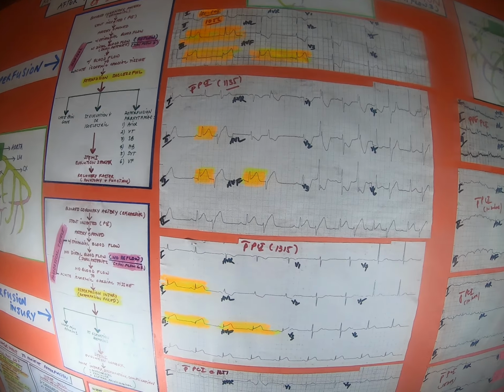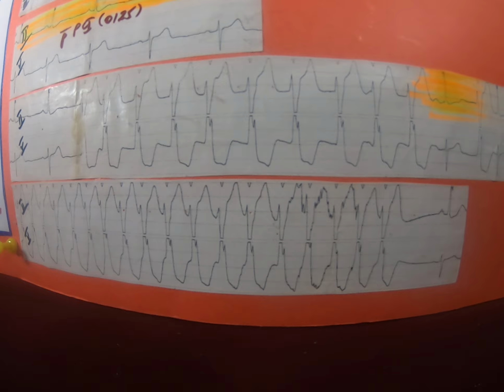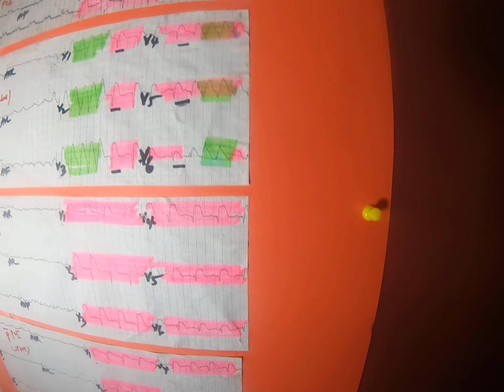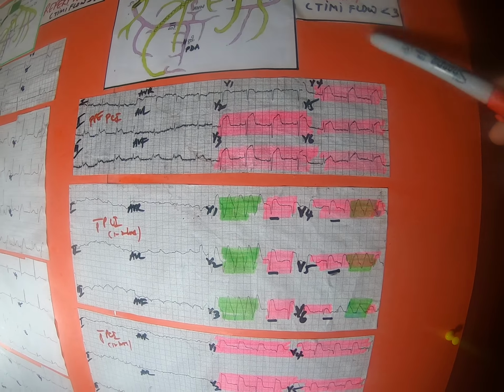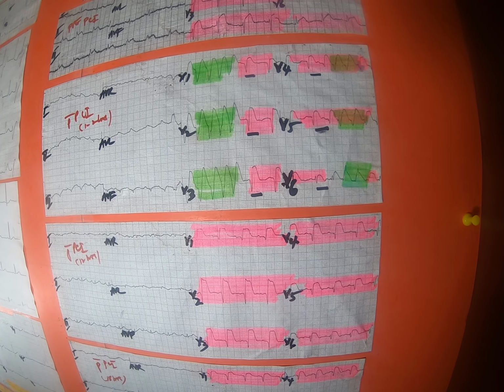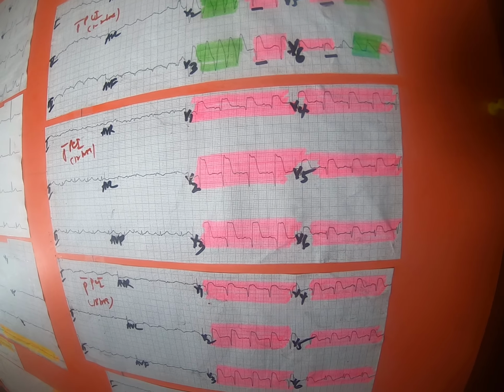You see here again, the reperfusion arrhythmias are caused by automaticity, not re-entry. And here we also got slow VTAC, but again we don't have a reperfusion here. So keep an eye again, lytes and everything have to be checked, as I said. Full assessment, avoid failure, avoid restenosis, and keep an eye on those arrhythmias.